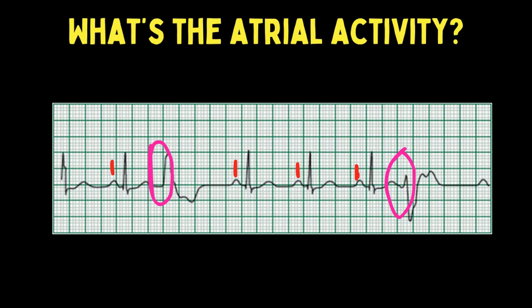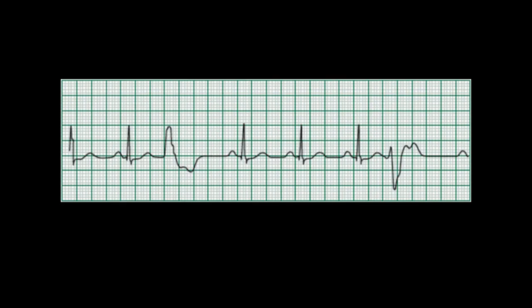What about a ventricular rhythm? Well, the rate's not slow, but these certainly look wide and bizarre. And wide and bizarre should trigger you to think ventricular beats. They don't have a P wave before them, and we know that ventricular beats don't have P waves before them because they come from below the atria.